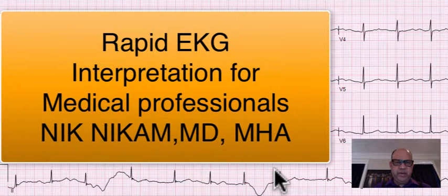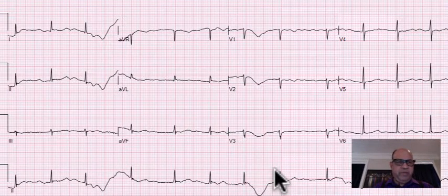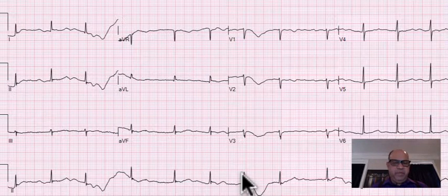I am Dr. NIKAM, and I would suggest you grab a notepad and a pencil so that we can learn something about each electrocardiogram we're going to read. There are probably a little less than 100 EKGs here. We are going to read it in a rapid session, so get ready and let's begin.